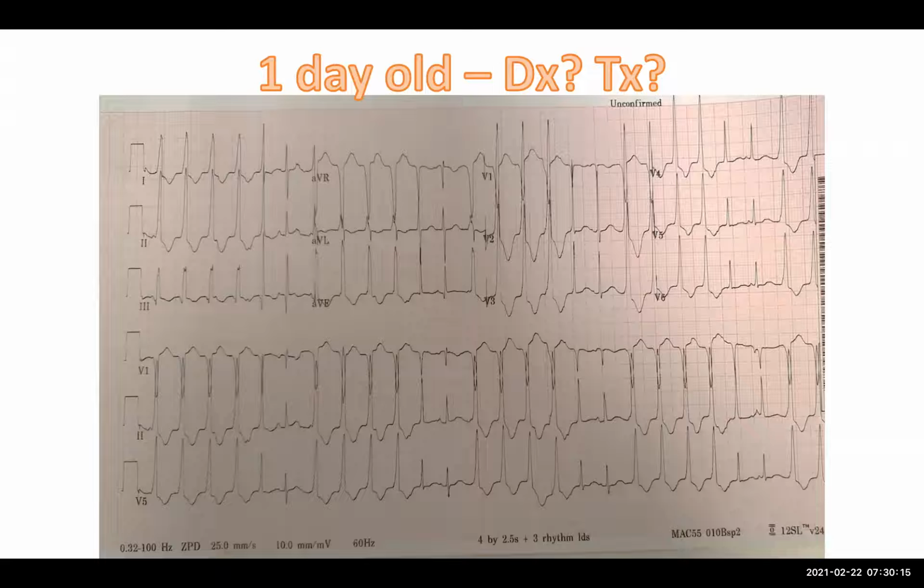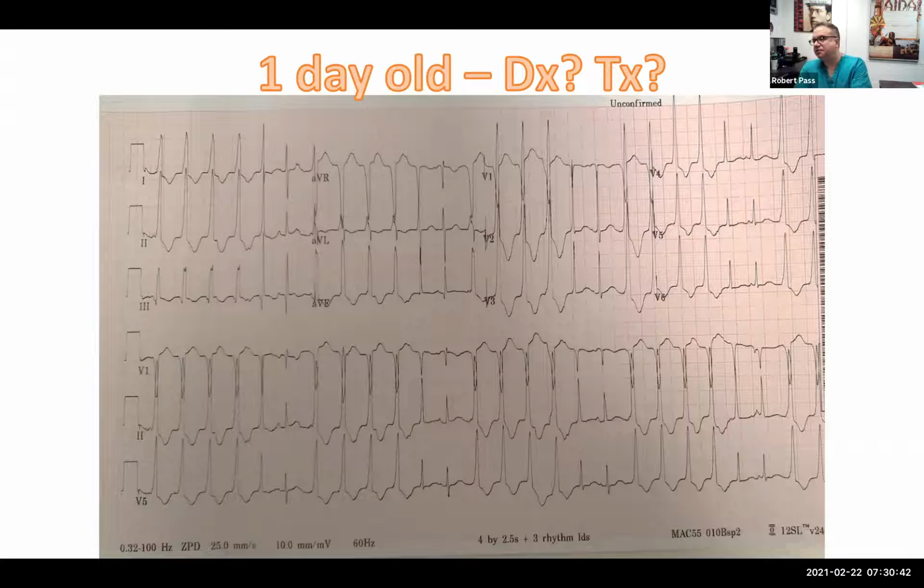So I think there could be cardiomyopathy, either causing the ventricular arrhythmia, or as a result of the baby having been in a ventricular arrhythmia. So I'd want to evaluate for cause and also effect of the arrhythmia. Do you have any idea where this arrhythmia is coming from? Can you tell from this EKG? Maybe RVOT. Yeah, it's RVOT, right? Because it's a left bundle morphology, and it's positive in the inferior leads. So it's coming in the direction from top to bottom and from the right ventricle. So this is an RV outflow VT.